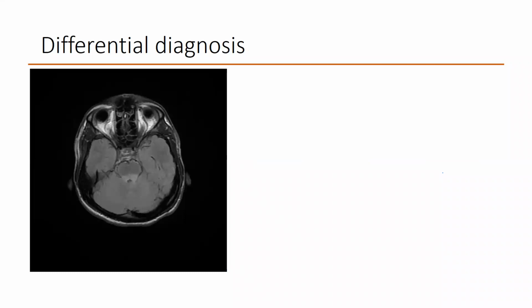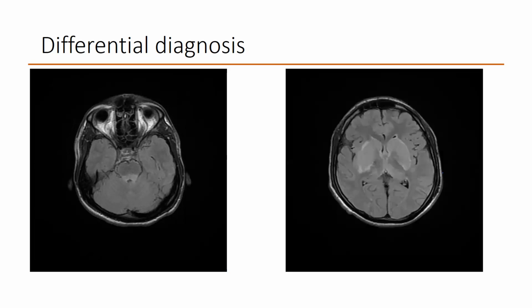So this is one of the differentials of enterovirus encephalitis. Can you tell me what else can cause a similar picture? Listeria. Like I mentioned earlier, both images are of the same patient. This is the patient with rabies encephalitis. Rabies can affect the dorsal pons, the thalamus, the basal ganglia, and sometimes there can even be cortical swelling. So it is a close mimic. If supratentorial involvement is there along with the rhombencephalitis picture, then rabies is one of the differentials.